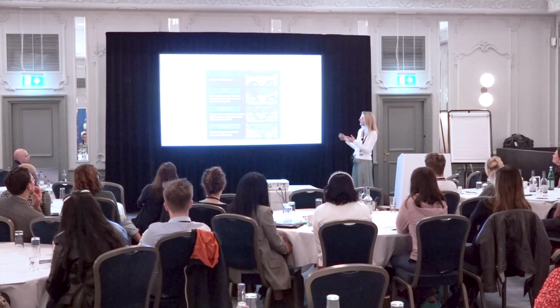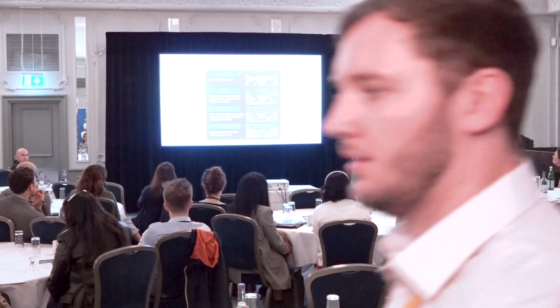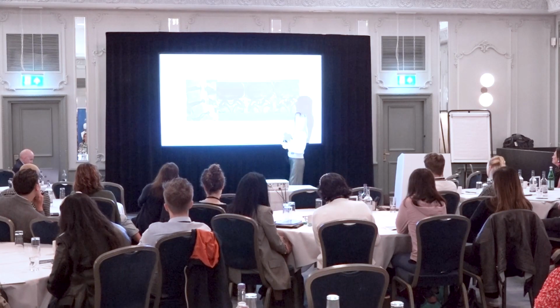So I often see cases that are called severe stenosis, and I would think only mild or moderate. So this is just showing you some stenosis. You can see on this picture here, you've got degenerate facet joints, you've got buckled ligaments, you've got synovial overgrowth, and you've got some effusions. And you see that canal, I'd say, is mild narrowing, but you can see the lateral recesses are narrowed, and you're probably pinching your nerve roots.